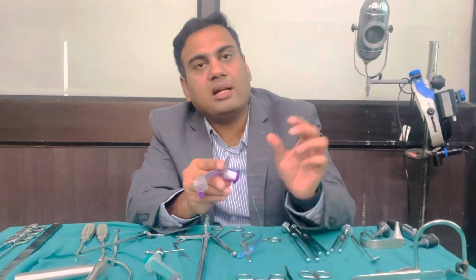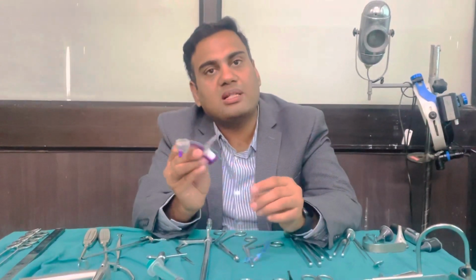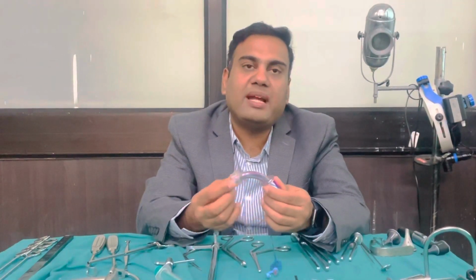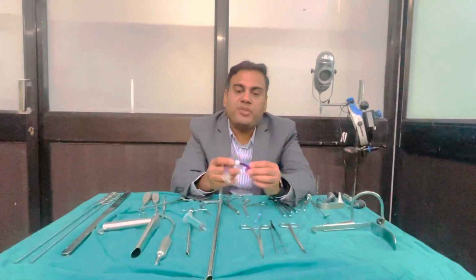You can also connect it to a ventilator and check the settings, which will guide you whether it is in the airway, and whether it is generating the required tidal volume. And of course, with this blue lining, you can take an X-ray and check whether the tube is in place. So these are the different ways to check the tracheostomy.